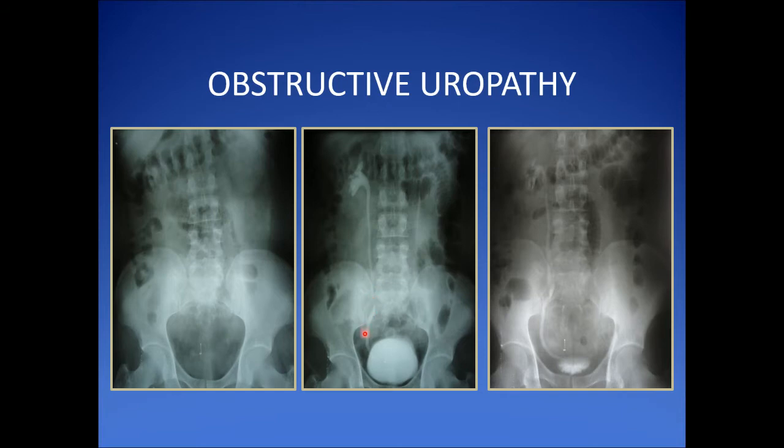So this is abnormal compared to the left one. Because of the peristalsis here, you cannot see the entire ureter. Even on the post-voiding or post-micturition image, one could still see the entire right ureter because of this lithiasis at the ureterovesical junction.